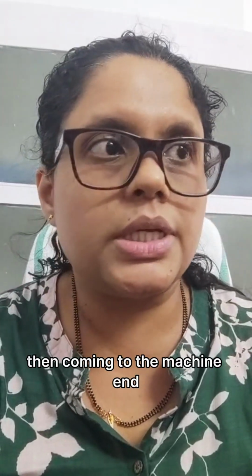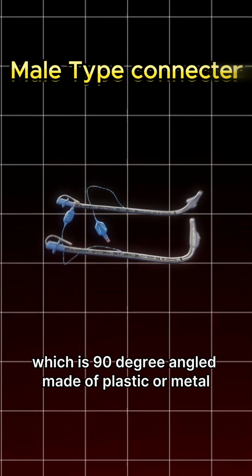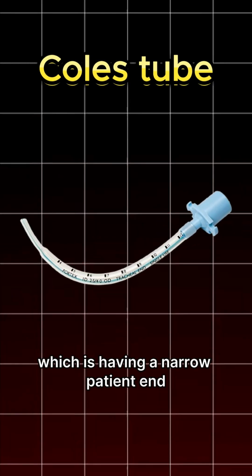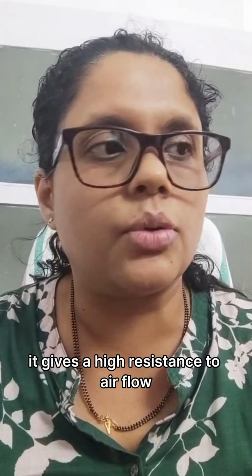Then coming to the machine end, you have a male type connector which is 90-degree angulated, made of plastic or metal. Then coming to some special tubes, you have Cole's tube, which has a narrow patient end. It's used only for emergency neonatal resuscitation. It gives a high resistance to airflow.